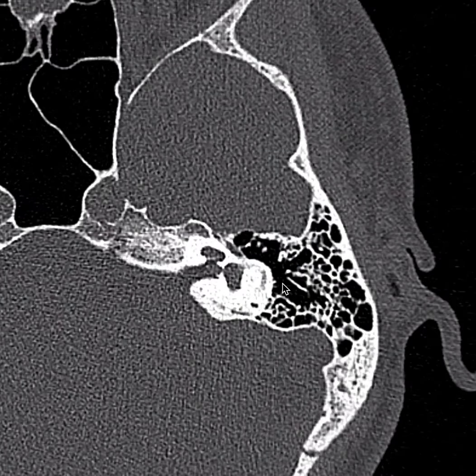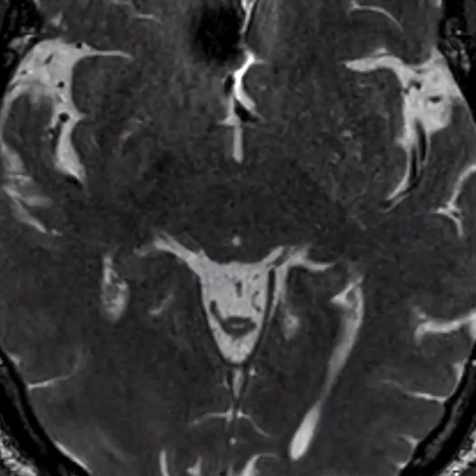So now, the internal auditory canal has a lot of nerves transmitted through it that we honestly need to look at on an MRI. And in fact, we're going to now review several cranial nerves as they go through the cisterns around the brain, and then we'll focus in again on our facial, vestibular, and cochlear nerves in this region. And we'll use a steady-state free precession sequence to do this review. This is an axial steady-state free precession sequence through the brain. We're at the level of the midbrain and right and left cerebral peduncles.